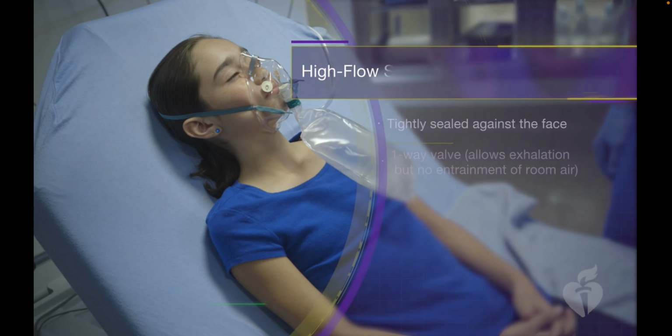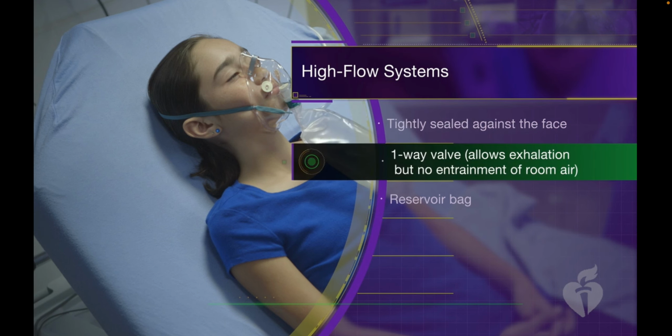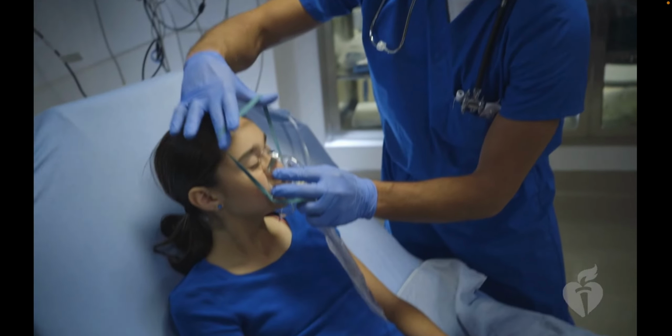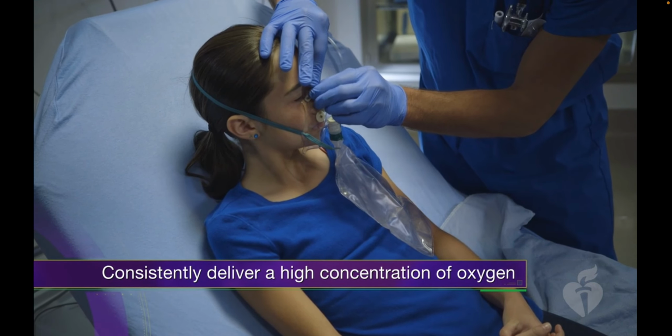They come in two varieties, those that have variable oxygen concentration and those that do not. These systems include a mask that is tightly sealed against the face, one-way valves that allow patient exhalation but no entrainment of room air, and a reservoir bag. A commonly used high-flow system is the non-rebreathing face mask. One advantage of this device is that it allows you to easily deliver a consistently high concentration of oxygen approaching 100%.